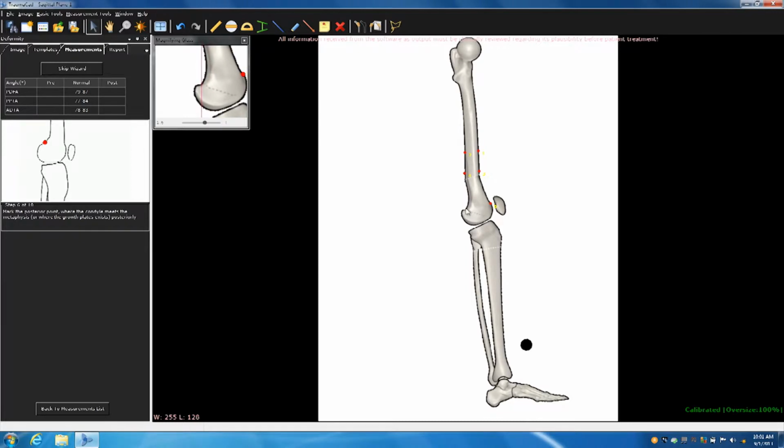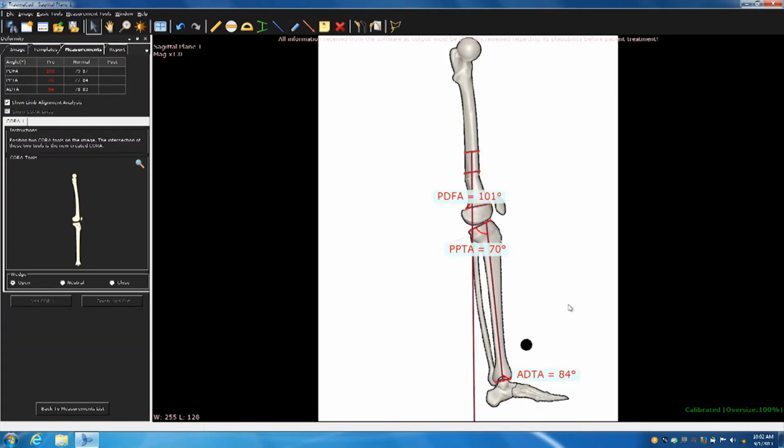And remember, the distal femoral joint line is the physeal scar. If you don't have a physeal scar, look for the little notches of the condyles. You'll see a little contour as the condyle comes around anteriorly and how it hooks around posteriorly in most people. So you finish your analysis. Pretty easy to see on the schematic.